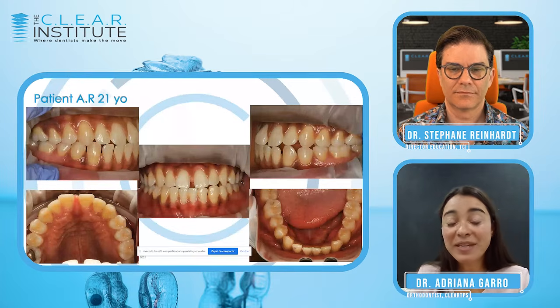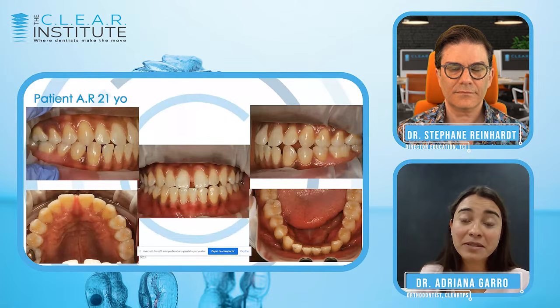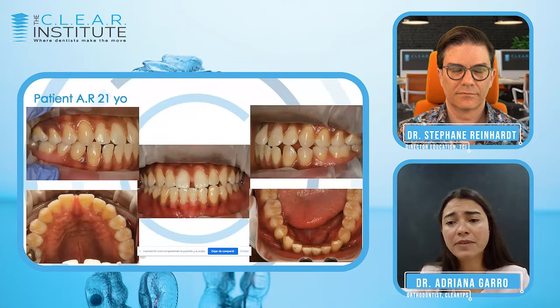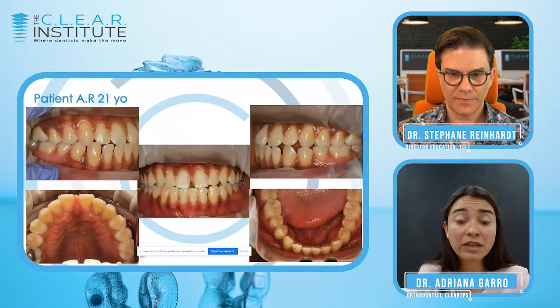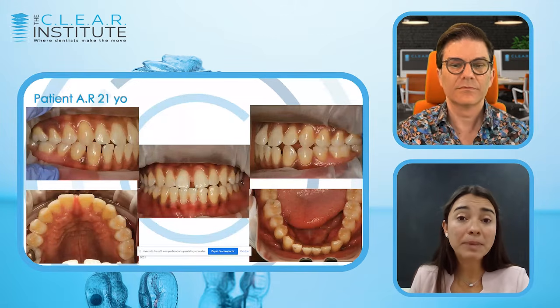Now remember the ethnic characteristics are important, and diastemas in Afro-American patients are very common. They have a very strong soft tissue component, and it's very common to find patients that don't want to close their diastemas, because it's a natural characteristic. They have grown with them. They see them in their families. They want to keep them.